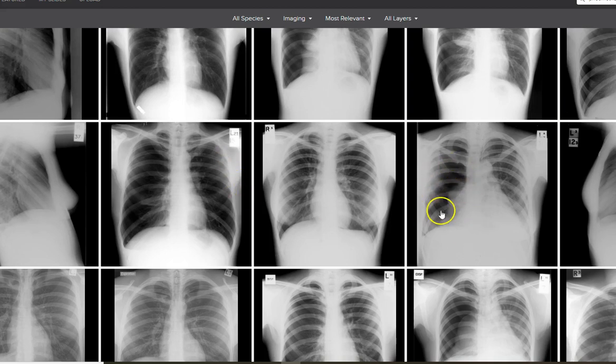But if they're really big and causing pressure, then they would need to definitely put some chest drain in and do some definitive treatment. And that's their decision, but the important thing is, as long as there's a pneumothorax and as long as it's undrained, that's a contraindication to many techniques.